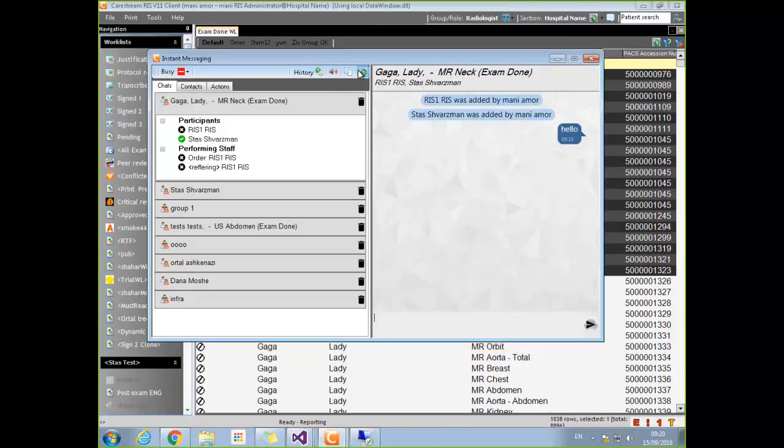If I refresh it, it's signed one. Okay? And it happens to all the context-aware chats here.